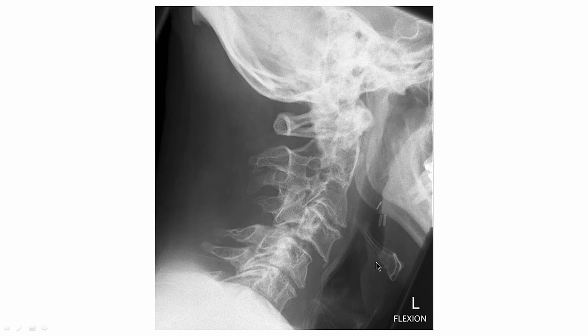Okay, look at this one. Really quick. I explained this a lot more on the other ones. But look at the spinal laminar line here. Looks good, looks good. I could draw a line here. Whoops, where'd it go there? Here it is up here. So this is obviously an anterolisthesis. This is a facet dislocation. So not a good thing, very dangerous situation. One of the facets jumped the tracks here. You can see this better on CT, but yeah.